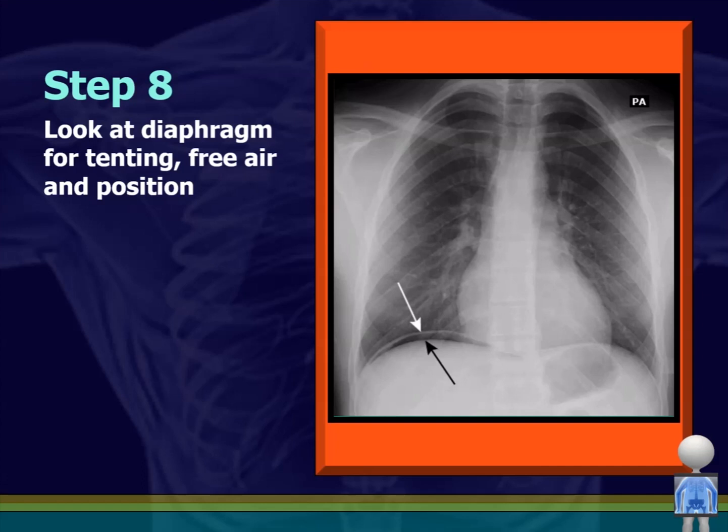One of the things we most importantly don't want to miss here is an example like there is in this picture. So the white arrow, this is the diaphragm. Okay, this is the diaphragm, the white line. And this is the abdomen, and there's a darker area underneath the diaphragm. So what is it that causes things to look darker? Because it itself is not dense at all, it's air. This patient has free air in their abdomen.